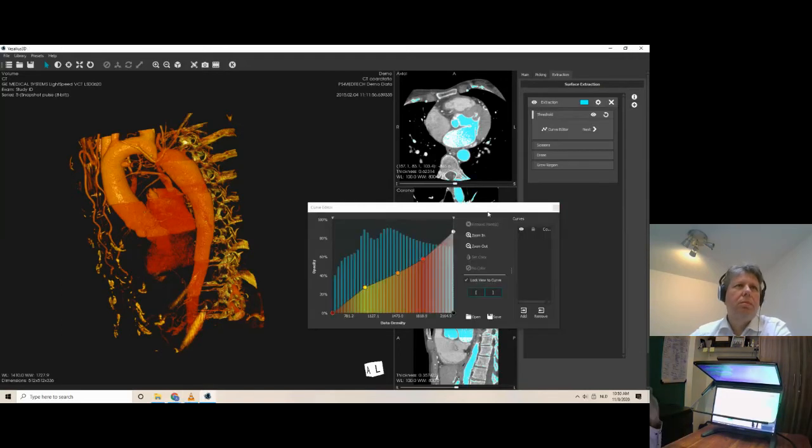I have a slow computer. Here you see the curve editor, and this is the screen which you use to select the data set and the pixel intensity that you want to use. Here on the right-hand side, I'm moving it. You see, to the left, there is nothing changing. So I'm happy with that. Then I want to click over to the right-hand side and see if I can open up this thing.